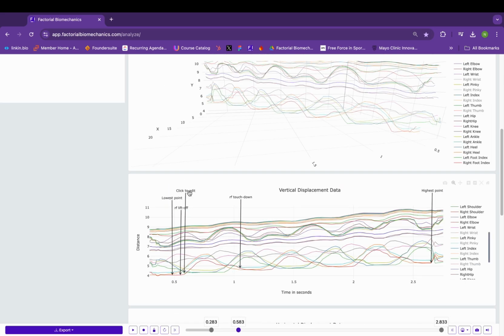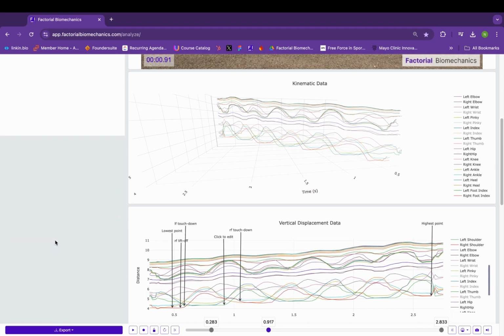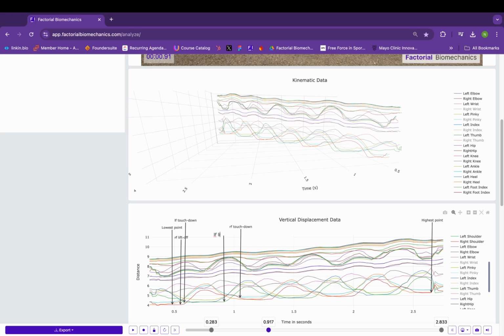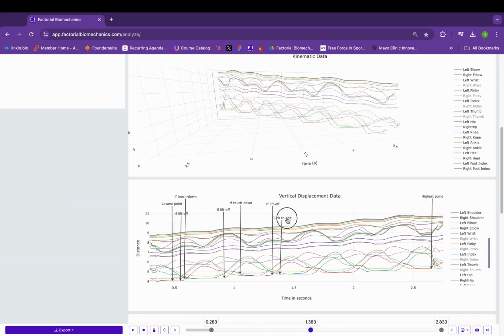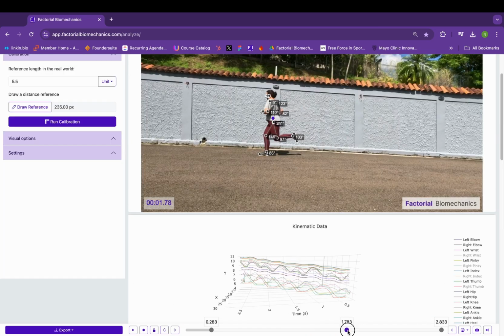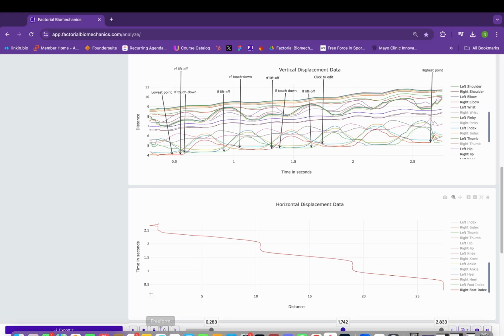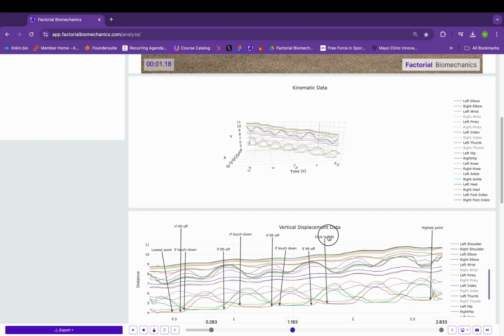Now we're going to do the same process for the left foot. When it's lifting and when it's touching back down. I'm going to repeat the process for each step. Keep in mind that I'm jogging up an incline and I have very short flight times. A real 10-yard fly will produce a very different graph with fewer, longer steps and greater flight times.